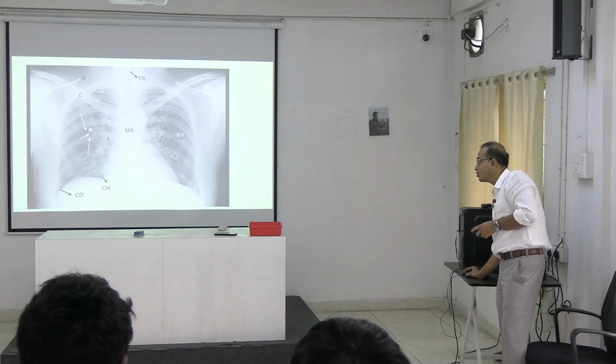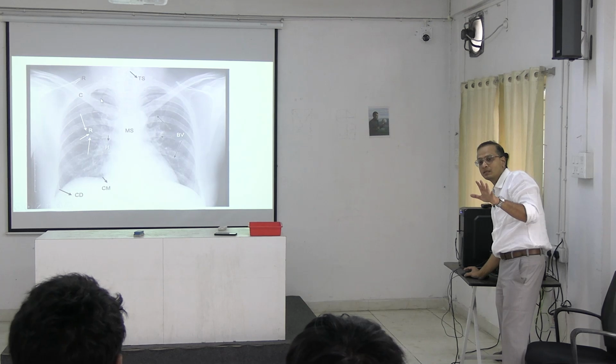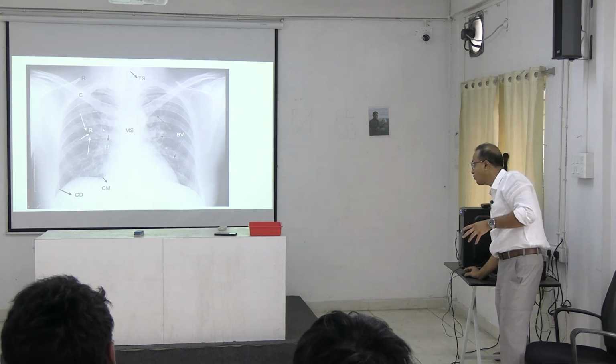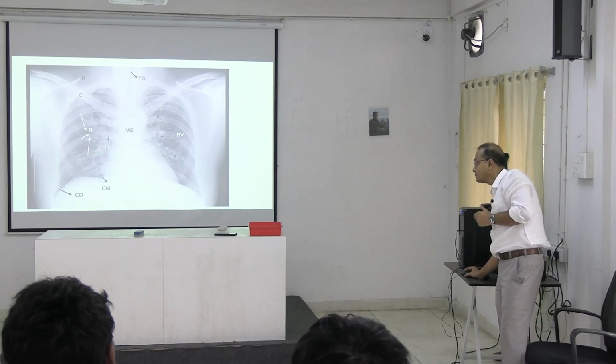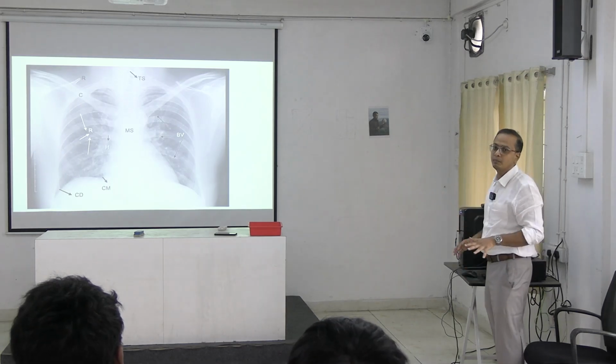In this region the bronchovascular white part is more dense. Compared to that, as you move to the peripheries, the white part becomes a little faded and the black part becomes predominant. So, these bronchovascular markings are more pronounced in the central or mediastinal part. As it goes to the margins, it becomes faded.